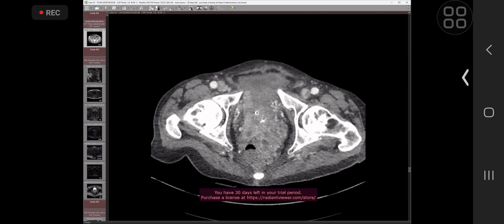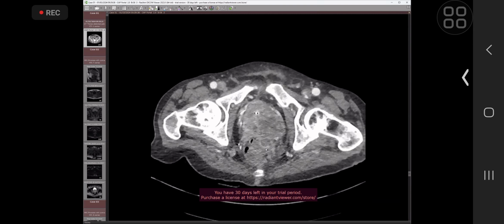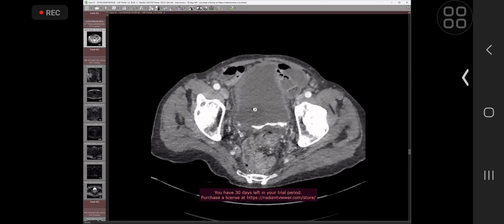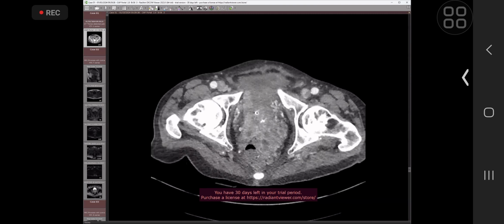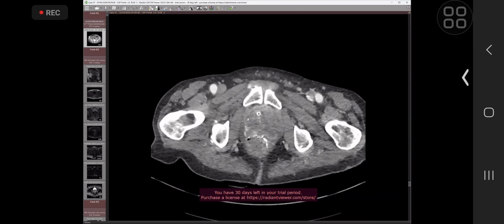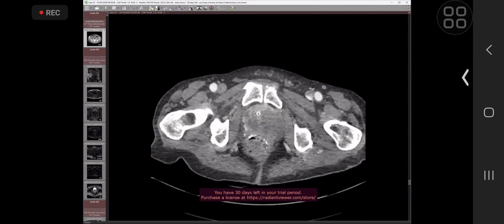Okay, and we have a raised PSA. There's the history. I'm taking control again. There's the history of the rectal cancer, and there's these clips right from the low, and that was the surgical suture lines that I just wanted. Yes. Yes. I was aiming towards.